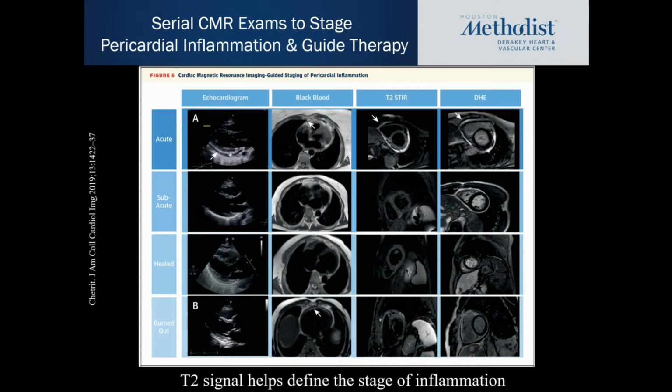And then, as the disease process continues and you go from this inflamed state to more of a fibrotic state, now your LGE as well as your T2 will no longer be positive. So CMR can be very helpful in staging disease and therefore helping guide therapy.